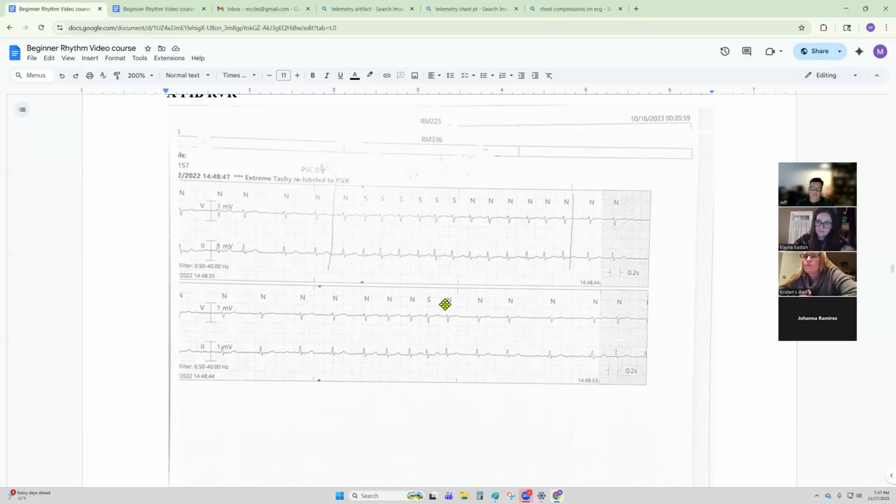People will say that's RVR. And what that stands for is rapid ventricular response. But I think that's their norm. In my opinion, that's their norm. For me, RVR is the even faster little bursts inside of AFib, like right here. So you've got AFib down here, but you've got these little bursts of AFib. And sometimes they could just maintain that. If it gets to the point where they're maintaining 150s, 160s, 170s, yeah, you can call it RVR. Or, I don't know, it depends on who you ask on this question.